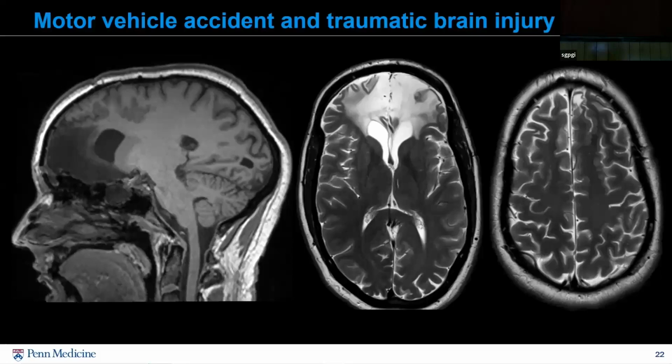He had frontal skull and ventral skull-based fractures and multi-compartmental intracranial hemorrhage. He now has extensive bifrontal encephalomalacia, a meningoencephalocele at the planum sphenoidale, and a small area of contralateral occipital encephalomalacia. But look at this, he also has polymicrogyria along the left superior frontal sulcus that may be the true source of his seizures. Now, he was the driver of the car, but apparently the car accident was actually caused by another motorist.